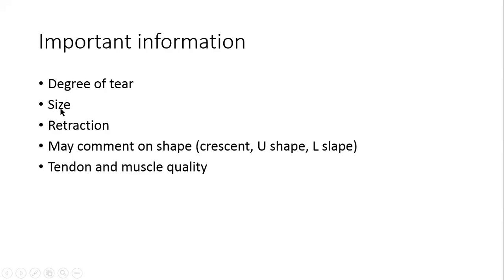If you see retraction of fibers, you can measure that. So you measure how far back the tendon stump is retracted. You may comment on shape. Now again, these are the classifications which are used in MRI when you grade the rotator cuff tear, because there is no limitation of posterior shadowing by any bony landmarks, so they can see it much clearer, especially in full thickness tear.